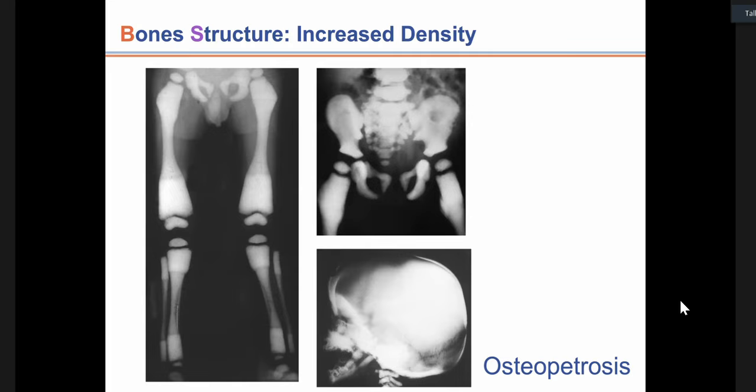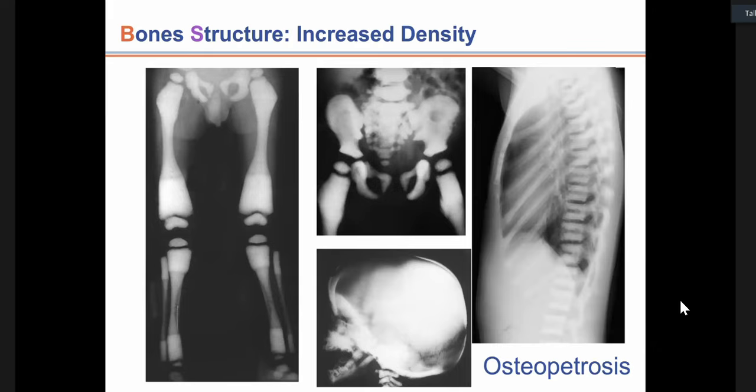When you treat a child with bisphosphonates, you're in fact giving them an iatrogenic osteopetrosis because the bisphosphonates inhibit osteoclast activity. Rugger jersey spine in the autosomal dominant types of osteopetrosis, the juvenile type, which is less severe, may not actually affect life at all. You do a chest X-ray for a cough and you identify this. Rugger jersey alternate increased densities, the sclerotic end plates in osteopetrosis.